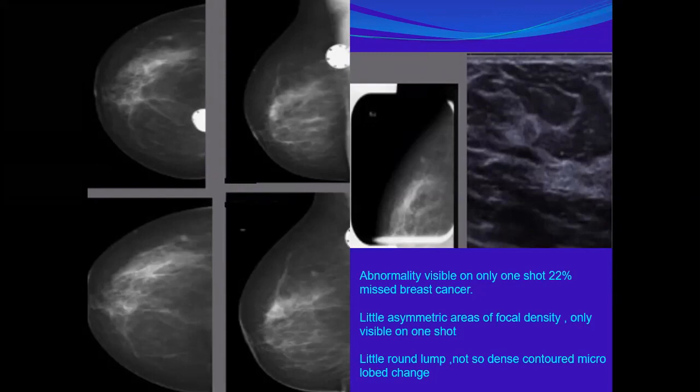So it is focal asymmetry. Now, will you call it a focal asymmetry, or do you have another name for that? Yes, it is a focal asymmetry, but what is the exact name for this asymmetry? Do you know it? Developing. Excellent. Why did you say developing asymmetry? Because in the first mammogram, it was not appreciated in the MLO. Now it is well appreciated, and the size as well.